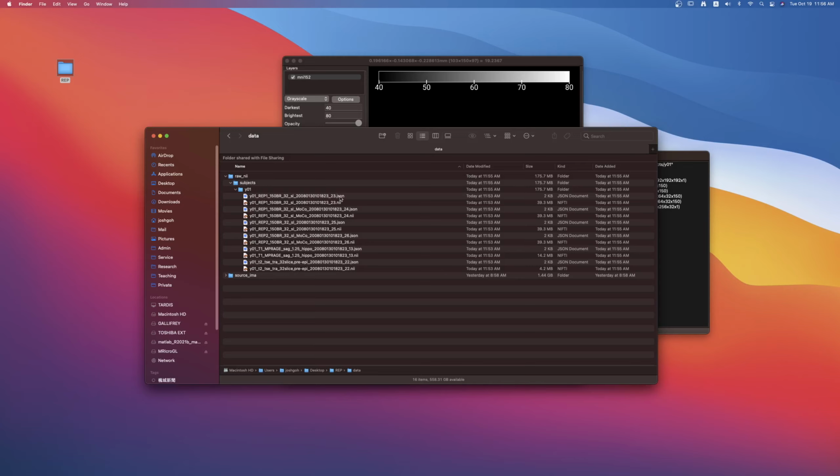You will also notice that along with the Nifti files, it also generates these JSON files. These are file descriptors, so it tells the system some summary information about the Nifti files. For the purposes of this course, we won't worry about that. We'll just focus on the Nifties, but you can leave the JSON files there. They don't hurt us any. All right, so at this point, we have completed the Dicom to Nifti conversion, and we can continue now to use SPM to operate on these Nifti files.